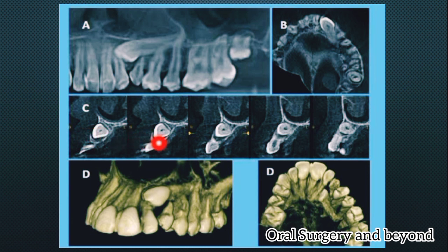Here in the sagittal section we can see that the crown may have very little bone coverage compared to the palatal part, right? So we can plan a surgery, we can start the osteotomy here. So like this we can plan the surgery. These are the 3D reconstruction models.